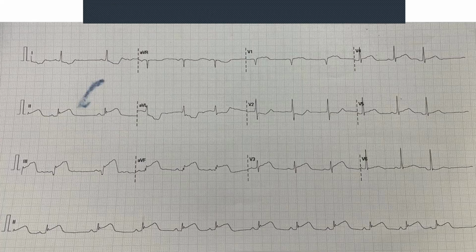So in other words, we expect these 4 to give you a similar picture, but they may not always, because V5 and V6 are looking through the heart that way, and 1 and aVL are looking from that side. So they can give you slightly different points of view, but the majority of the time they're all the same. So V5 also has this slightly high takeoff. It's starting off from normal and then going up, as compared to here, where it starts off high and just goes higher. That's an ST elevation. Whereas here, it starts off as normal and just goes up. That's not an ST elevation. That's a high takeoff. And in V6, we also see that it's just stretched along a little.